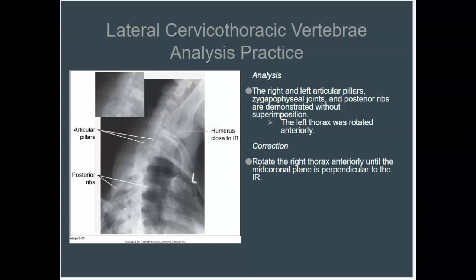And the reason that I can tell this is because the humeral head, oops, I'm trying to make an arrow here, but it's not working out. Let me erase that because that is very poor.